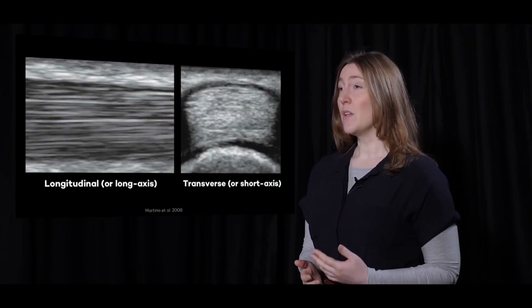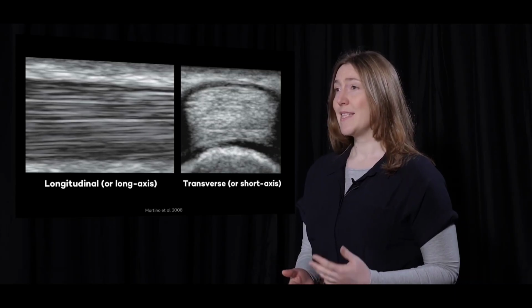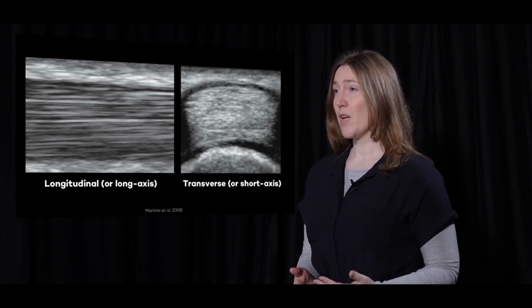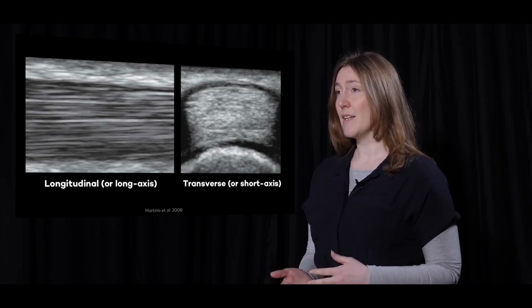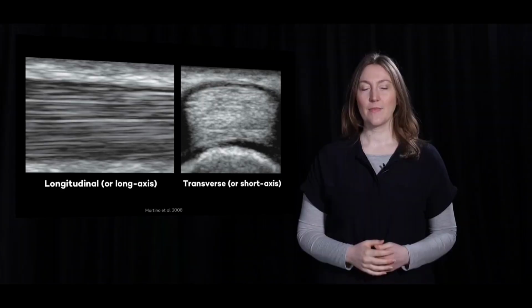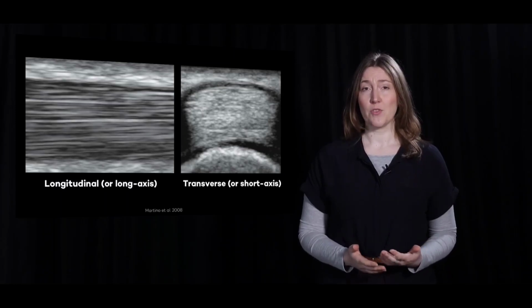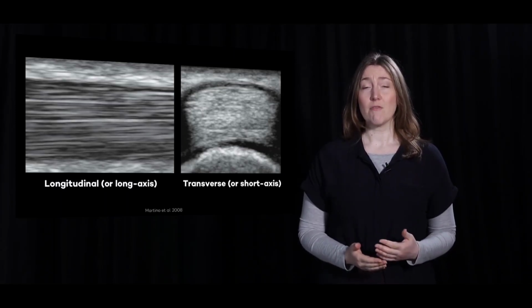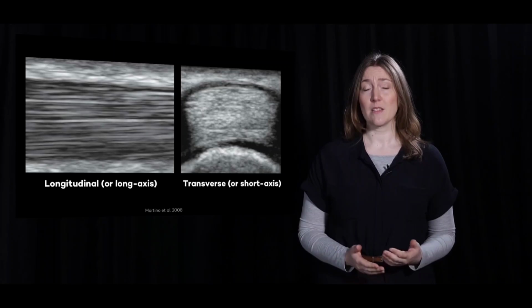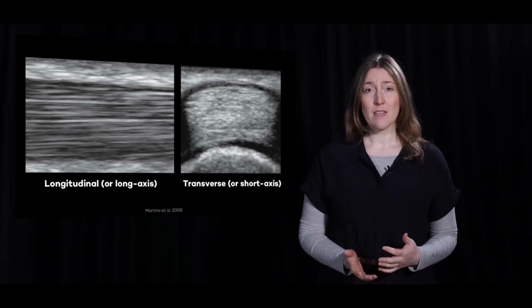In longitudinal ultrasound views, the tendons appear as echoic ribbon-like bands defined by a marginal hyperechoic line corresponding to the paratenon and characterised by a fibrillar internal structure. In transverse views, tendons appear as round or oval-shaped structures, characterised by several homogeneously scattered spots or pixels. The density of the hyperechoic fibres or pixels give the whole tendon a more hyperechoic colour.